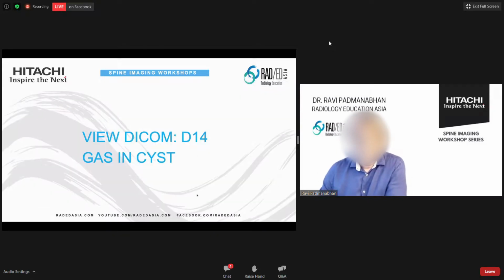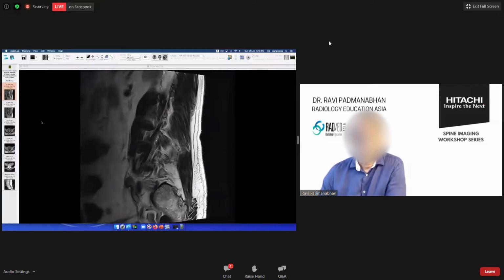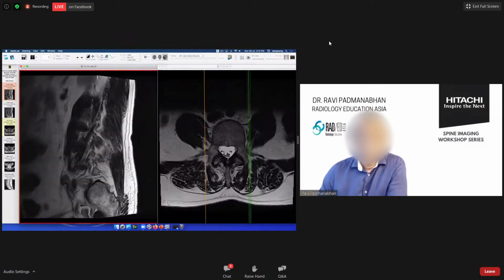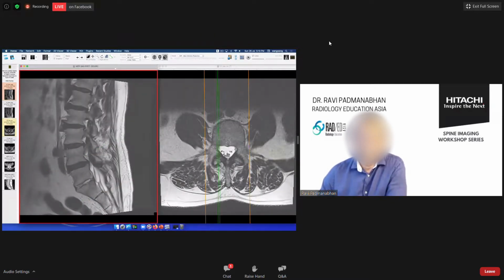Let's look at that case. Okay, so let's look at the CT first, because I think that makes it easier.